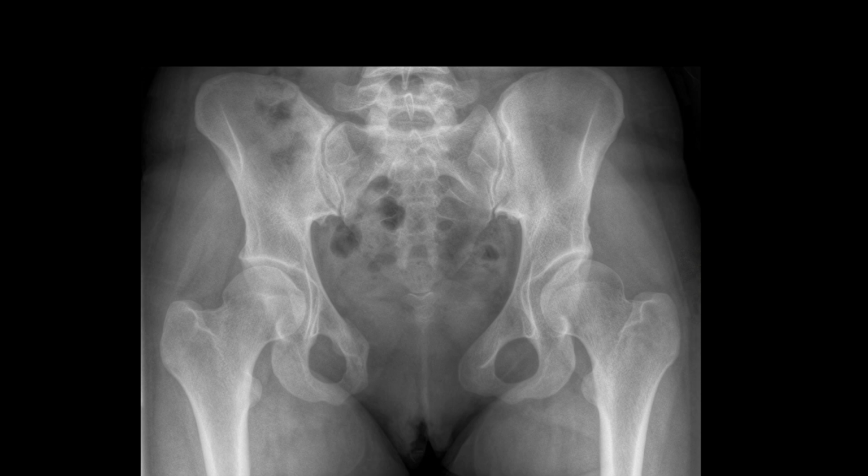So what I want to point out in this is, perhaps it'll be quite obvious, we have quite a significant widening of our pubic symphysis. Now, what we would usually expect in most patients would be by the age of 20 years old, we would expect this distance to be under 6 millimeters, and by the age of 50, we would expect it to be under 3 millimeters. Over here, we have what is called pubic symphysis diastasis.